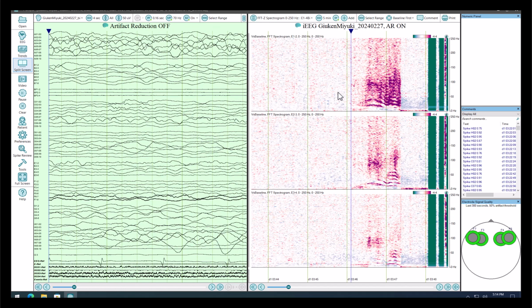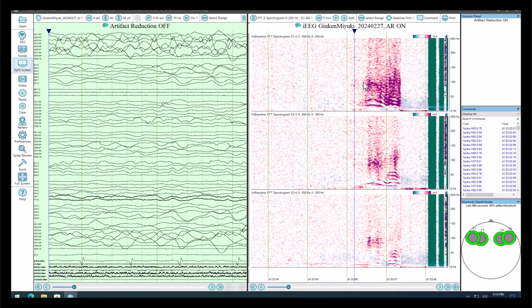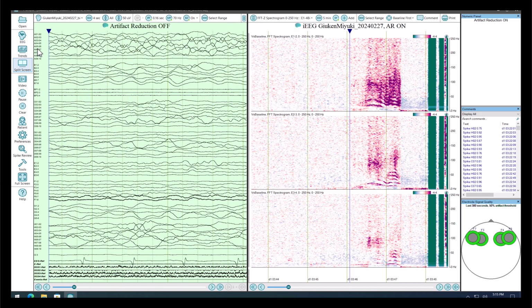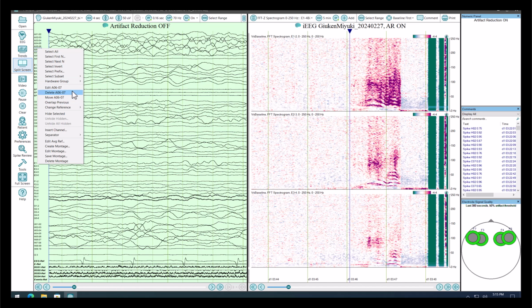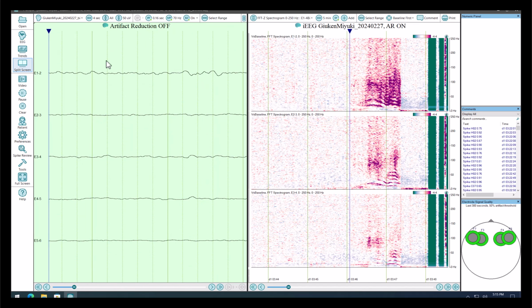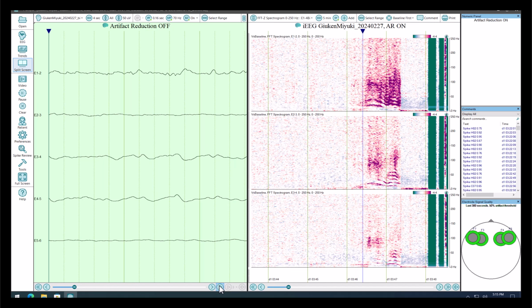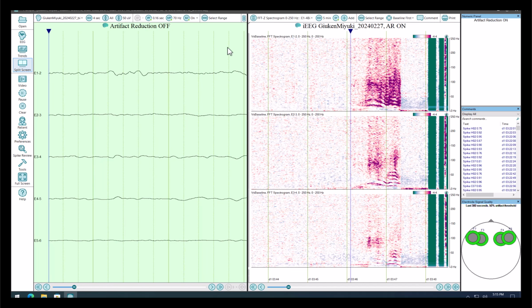So I've done that. I want to get before that change happens, so I'll go back here and look at just that set of hardware. We're going to right click on a channel hardware group and select the E hardware group. And as I page forward into this, let's see what happens. And let's go back a little bit. I just clicked on the trend on the right to move that.